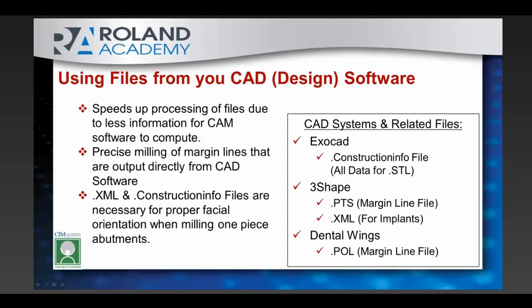Now, by default, most CAM softwares out there, as well as the SUM3D software, will automatically detect the margin as best as it can. Now, as many of you lab owners know, and some of you in production know, that may not always be the best detection, primarily because when the dentist preps inside the patient's mouth, he may come out with a jagged margin, and when you design a restoration around a jagged margin, you're going to end up with jagged lines along the margin on that restoration.